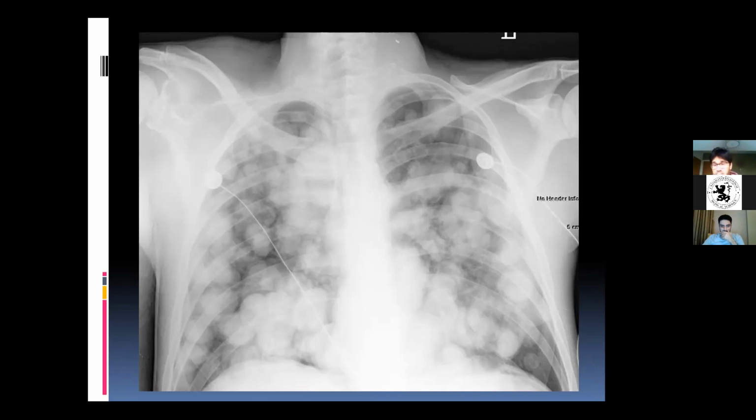I want you to go through your systematic approach, whichever it might be. You don't have to follow the ABCDE system if it's not for you. I want you to go through this x-ray and write down what it is that you see here, and potentially even try to come up with a diagnosis at the end. You don't have to share it with me just yet. Once we are done with the pathology section, we'll come back to this x-ray and see how your interpretation has changed. So 5 minutes, or maybe, you know what, just 2 minutes. You have to be quick at this.